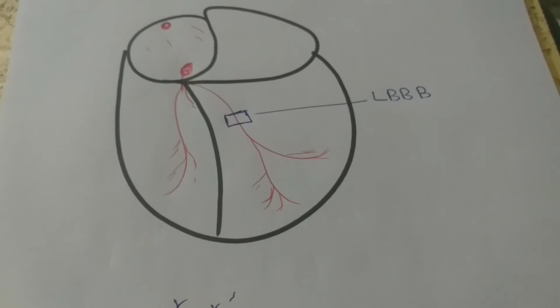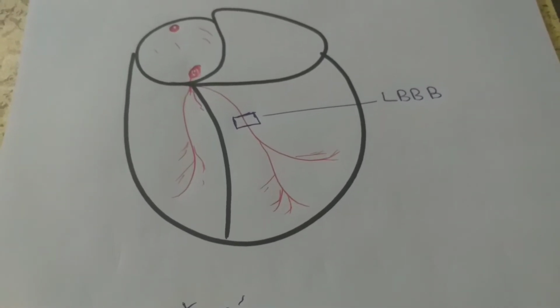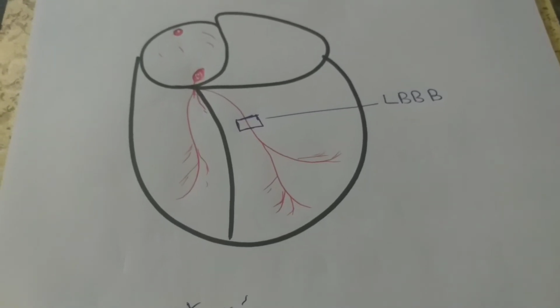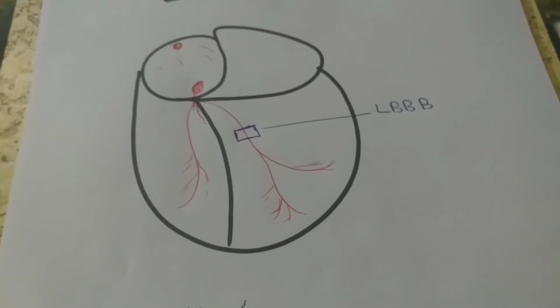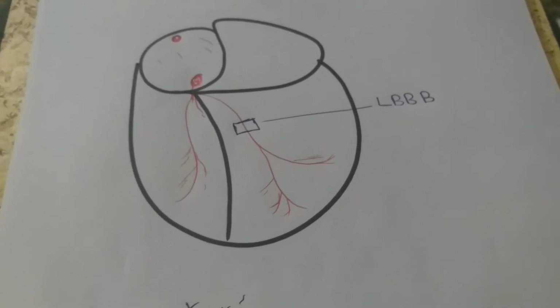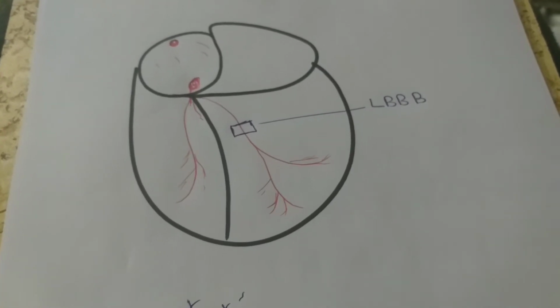Then you will have to see lead V1. If along with the broad QRS complexes there is a deep S wave in lead V1, it would be left bundle branch block. But if along with broad QRS complexes there is a tall R wave in lead V1 or V2, it would be known as the right bundle branch block. I'm talking about that confusion which happens when you do not find a specific pattern in V1 or V2 or V5 or V6. Then you will have to look at the status of V1, and obviously there should be broad QRS complexes. It is the basics of bundle branch blocks.